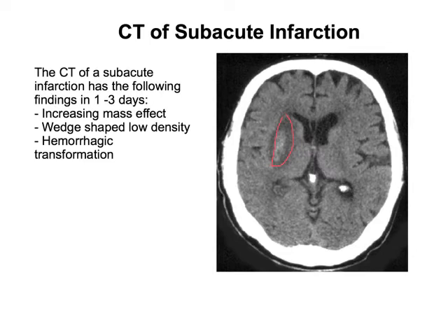Incidentally, this is not blood here. I believe this is just a calcification inside the lateral ventricle, which can be normal.